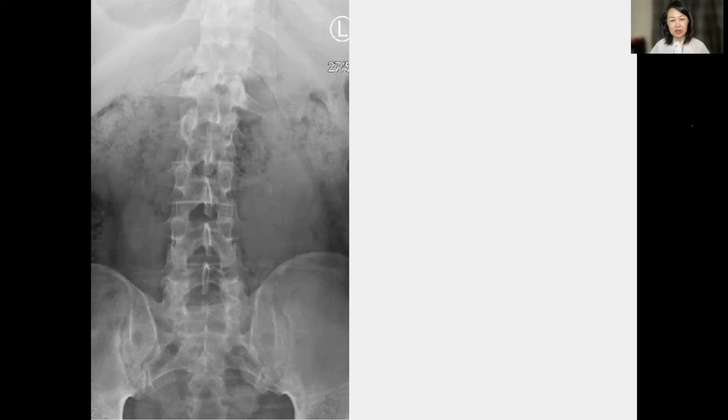Large bowel obstruction? No, large bowel will occur at the periphery, but I already coned the image, so it's not. Review area for abdomen X-ray.